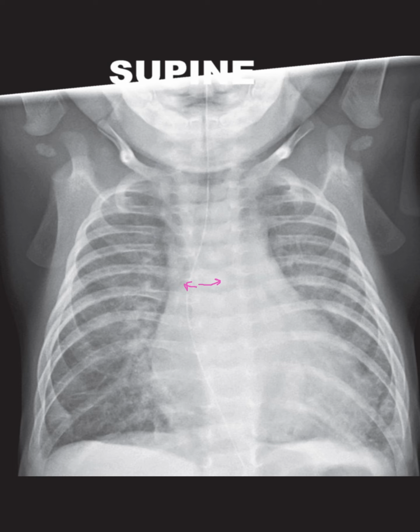All right, let's go through this case together. What we're looking at is a supine chest radiograph of an infant. A few key details jump out at me.